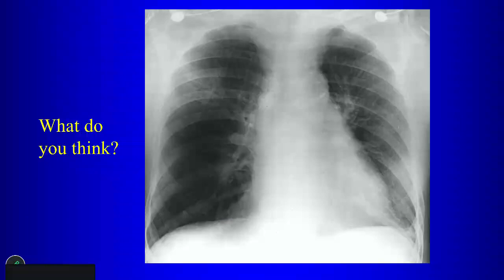Lucency in the right lung. So this area here, when you compare symmetrically from one side to the other, we see that this area looks more lucent, right? Now we've covered causes of hyperlucent lung before, but given that we're talking about vascular problems in this conference, what might give you that appearance?